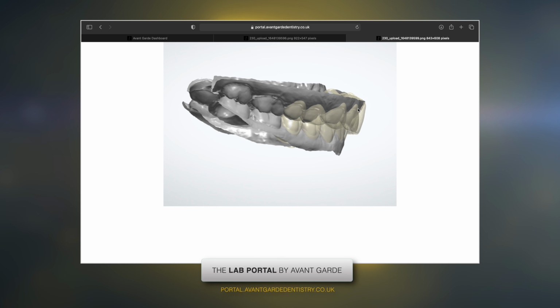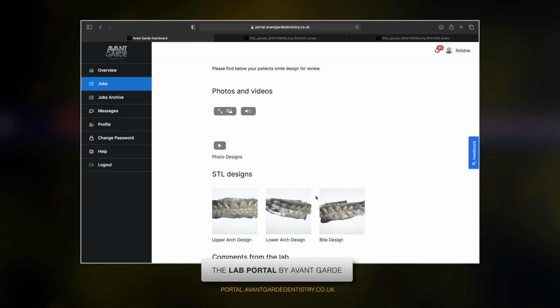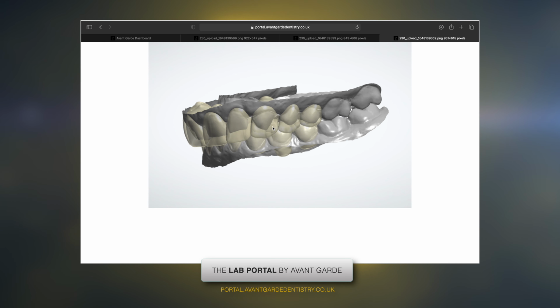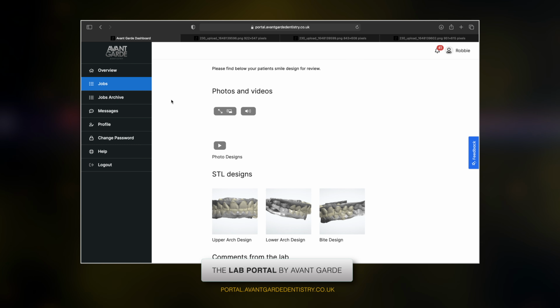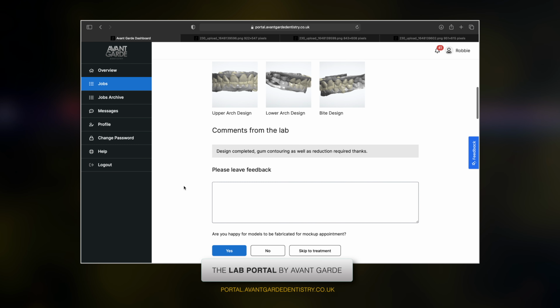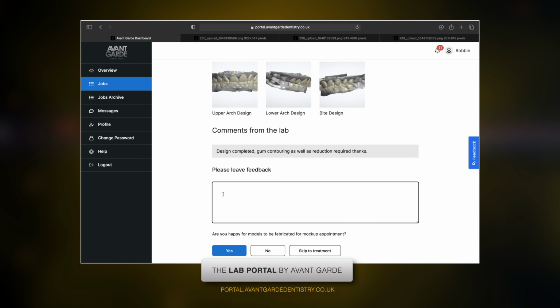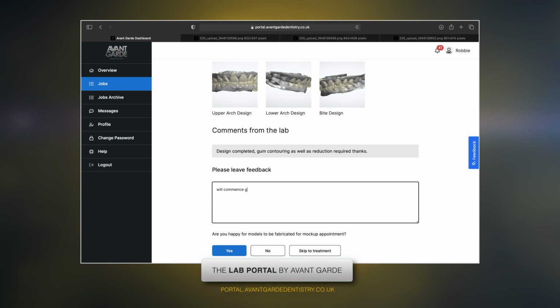It really gives us an idea of how this mock-up is going to be placed in the mouth and how it will potentially appear. It also allows us to communicate with the patient using these images on a screen where the addition takes place in length or from the gum position, so we can discuss crown lengthening and show them what the case would potentially be with or without crown lengthening to assist with the co-diagnosis.